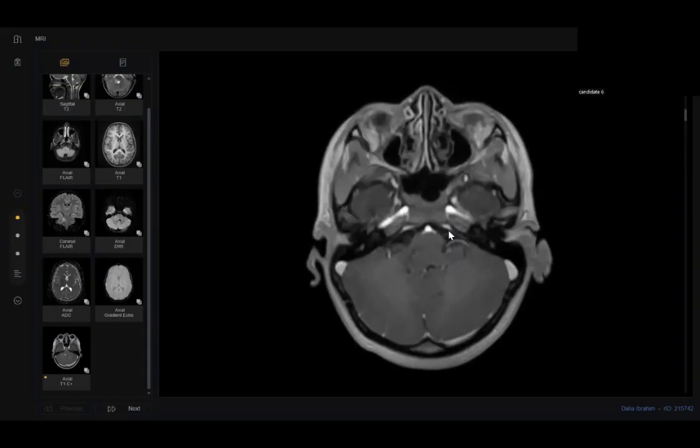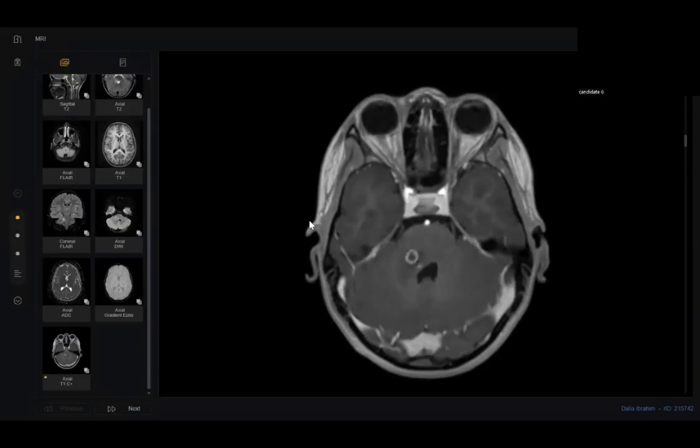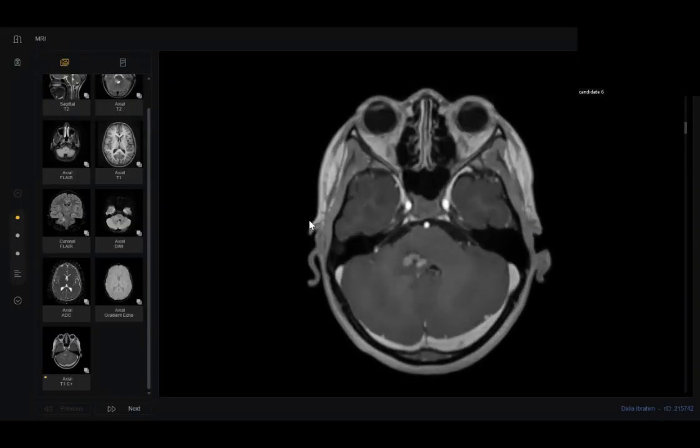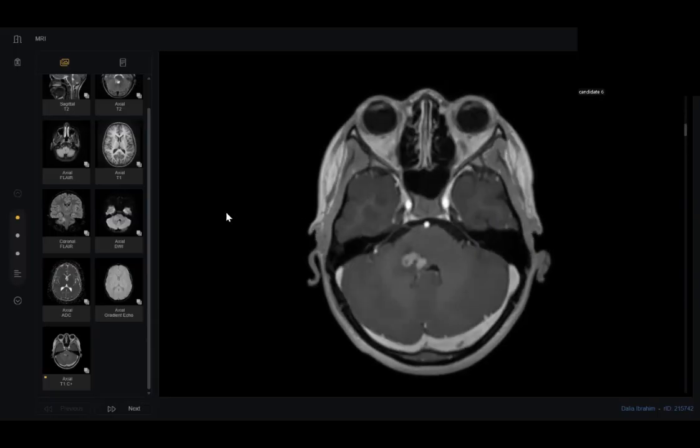Sir, next, I will inform the referring clinician about the findings. Before informing the clinician, the patient is still in your department, what do you want to do for him? Sir, there are no other lesions in the rest of the brain parenchyma. This is a solitary lesion. What do you want to ask about? Any history, any examinations? We can ask for a patient's chest X-ray or any family history or previous imaging.